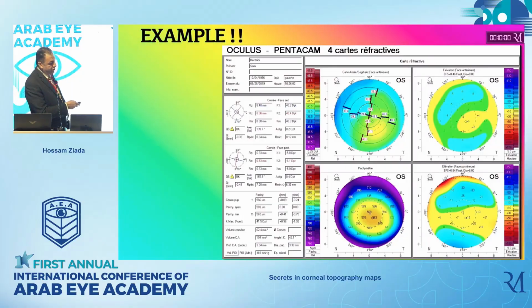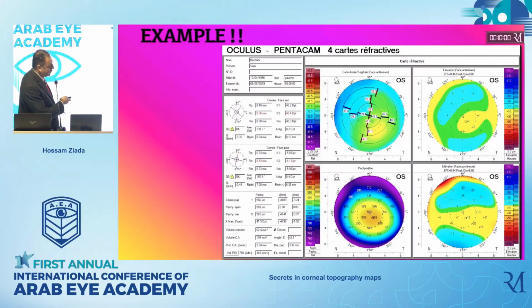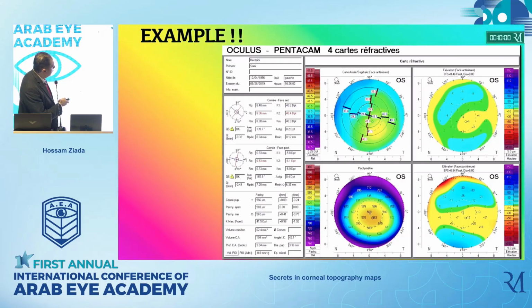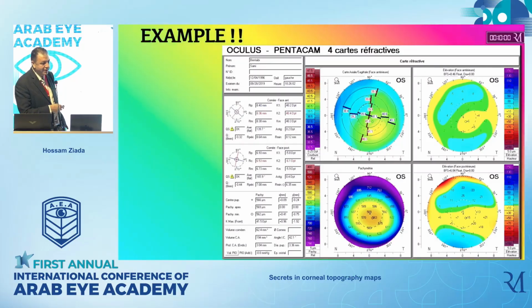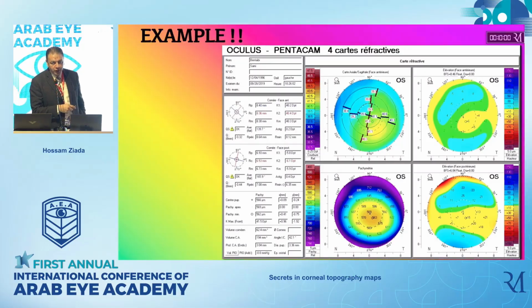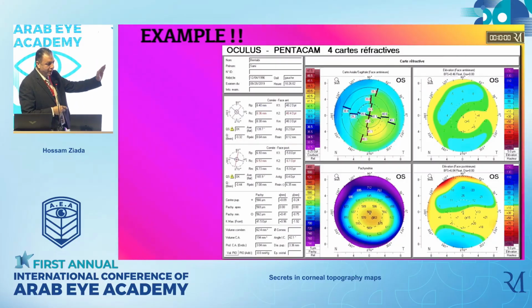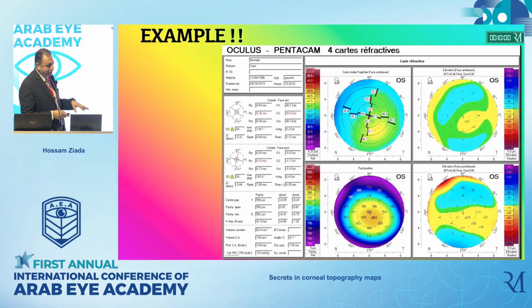Look here at this patient as one example. What about this Pentacam, in your opinion? You will find that the superior point is 39.9, the inferior point is 41. So there is a difference in the center of 3 millimeters, 39.8 and 41.1. The difference is less than 1.3. So still, according to the rules, it is mild suspicion, no sure sign of keratoconus up till now.